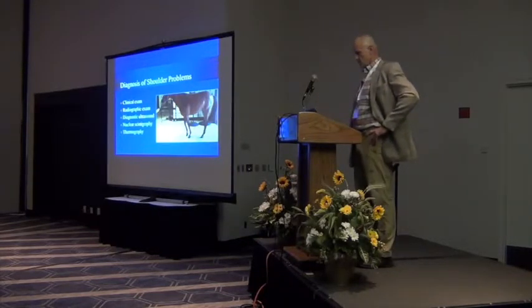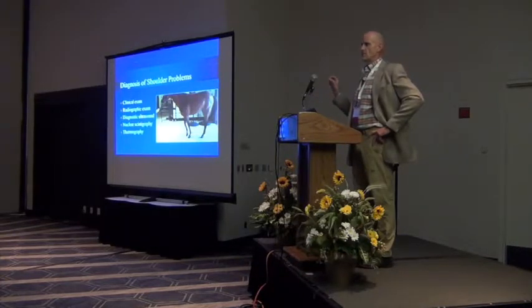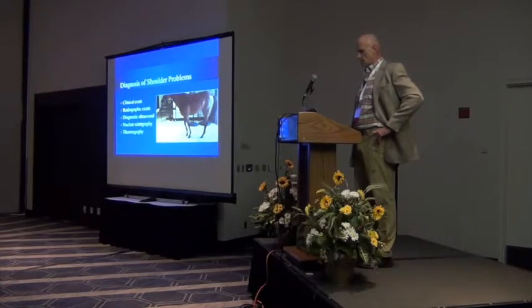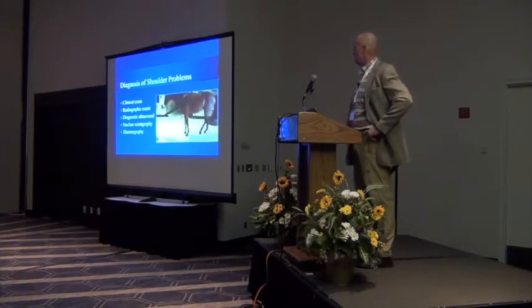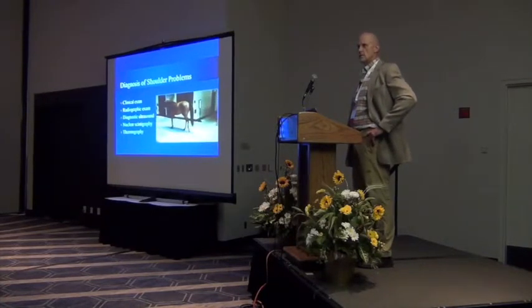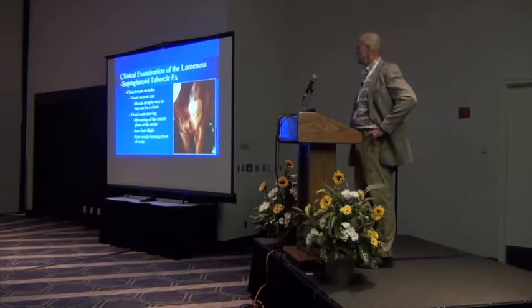Now this is just kind of your typical, and then most of these cases have had nuke med as well. And I like to do nuke med up into this area. We've talked about the cervical spine and things that are going on in some of these horses, and I think it's a great way to differentiate a lot of the different problems we see. Now this was, as usual, a veterinarian's horse. They can be quite confusing. That horse actually went home and after a month became sound without really a definitive diagnosis.